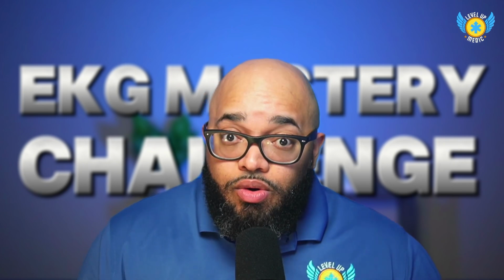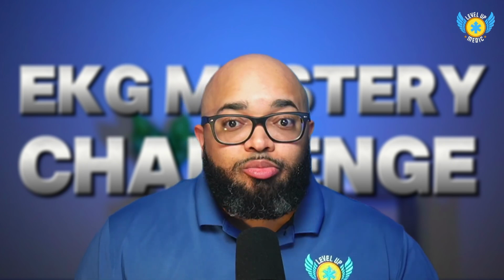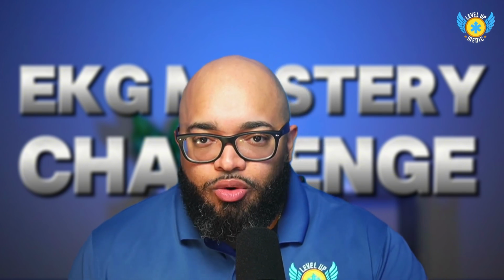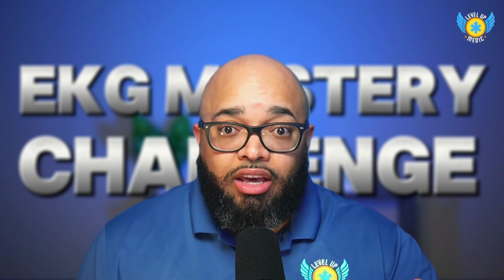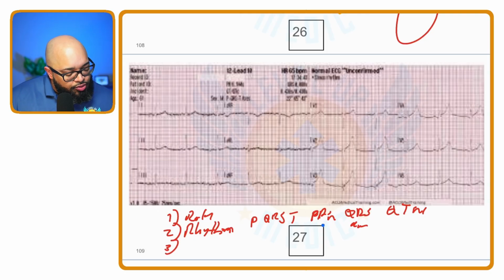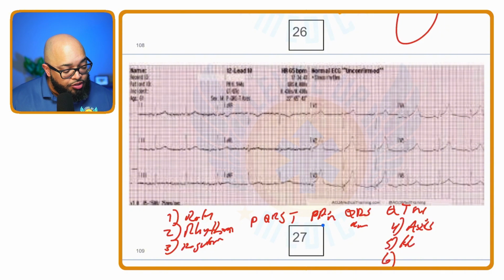If it's slow, we'd say sinus brady. If it's fast, we say sinus tach. But all of those have to be correct for it to be a normal or sinus rhythm. Step number three is we're going to check for regularity. Step number four, we check axis. Step number five, we check for hypertrophy. And step number six is where we're going to check for infarction.